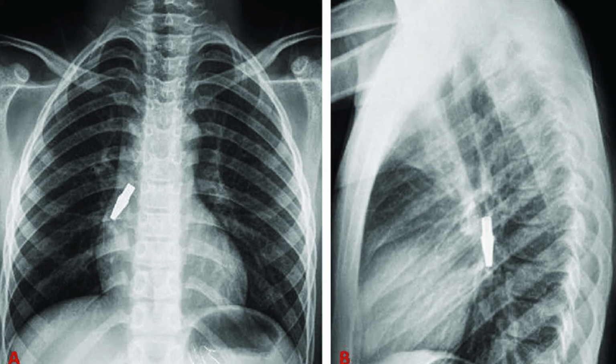That's what's going on. And this is just an AP and a lateral of the same thing. It's not the same child, obviously, a different situation here. But you see how this is going down towards the right mainstem. Because remember, the right mainstem is usually about 25 degrees. When you're looking at the lateral, you see it get wedged into that space there, and this would be your cardiac silhouette here. That's your cardiac notch, your silhouette. So it's wedged there.